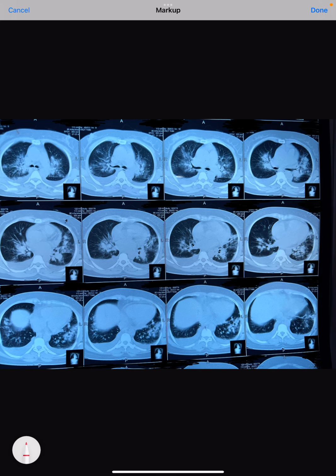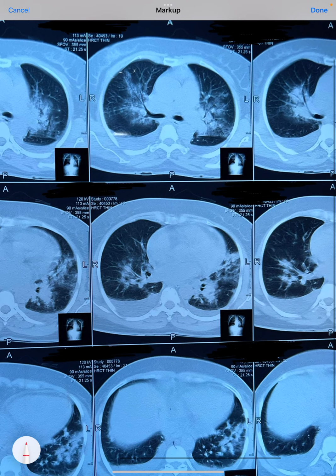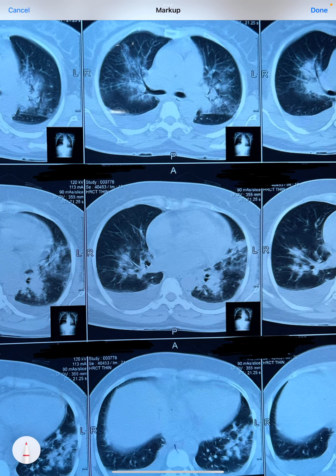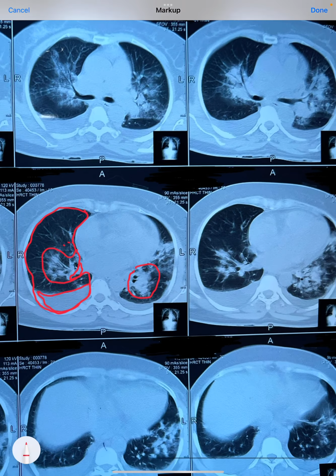Now, this is a very interesting radiograph of the chest, which can tell us about so many things. When we zoom into the films, we can see the lung fields, and there are problems at two areas. There is something in the hilar area, on both sides. So basically, there are two problems.